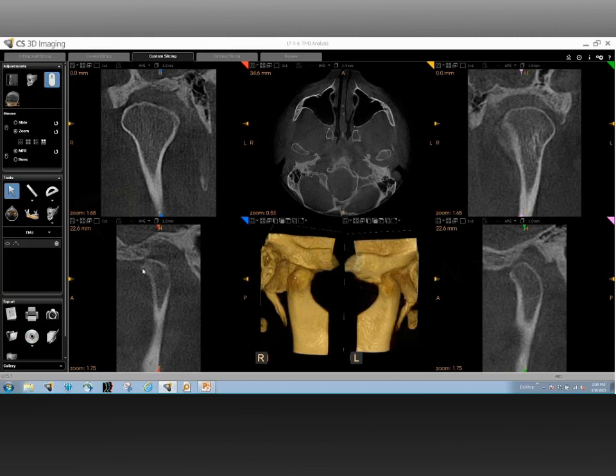Now, what do we typically look for in these things? We look at the smoothness of the surface, the smoothness of the structure of the condyle. We look at the smoothness of the articular fossa and any other changes. You also see a little bit posteriorly some mastoid air cells. As I'm pointing out right over here, these are the mastoid processes in which mastoid air cells exist.